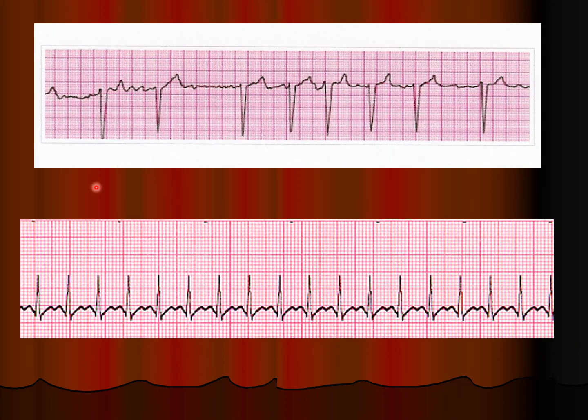Now, we're hunting. I'm hunting wabbits. No, I'm hunting for P waves. If I have to hunt, I don't have any. There's no P waves. Is this regular or irregular? It's pretty irregular to me. I hate it when this happens. You're like, oh, but I'm supposed to look. We know this heart's sick because we don't have P waves and we don't have a regular rhythm.